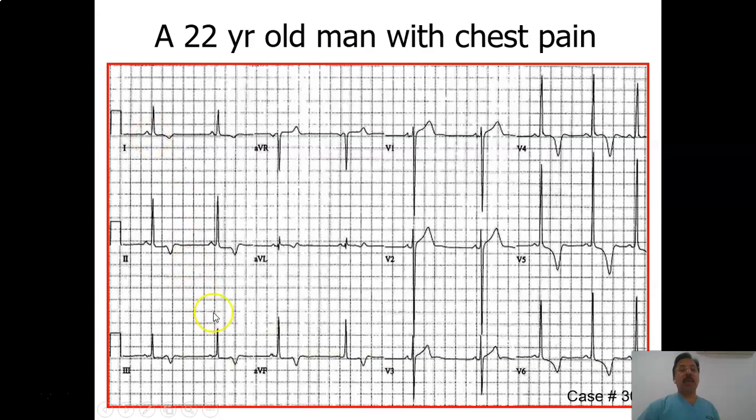Axis: lead 1 and AVF, normal axis. Hypertrophy: atrial, maybe a notched P wave, it's not sure, but left ventricular hypertrophy is obviously there, and with deep T waves, maybe a strain pattern. ST segment elevation may be seen whenever there is a high voltage ECG like this one. ST segment elevations are expected, and these are concave in shape, so this may not be dangerous. It may be a part of ventricular hypertrophy.